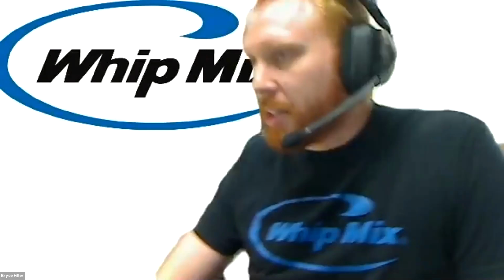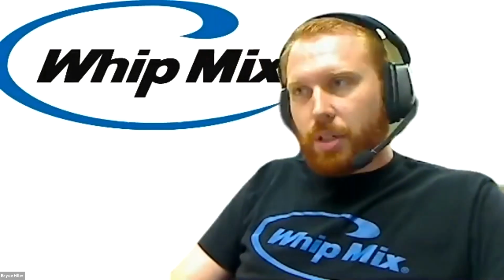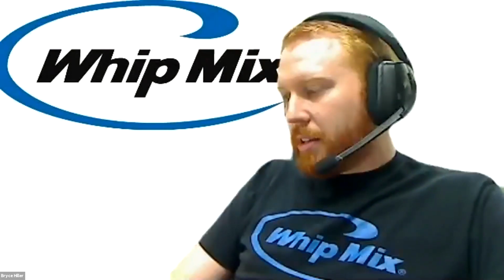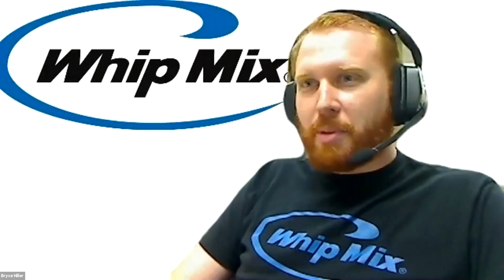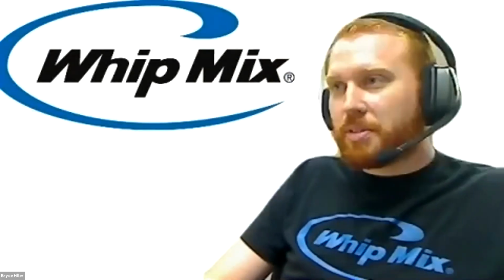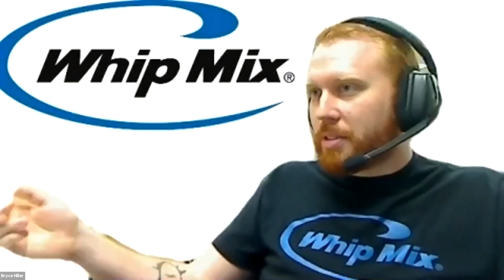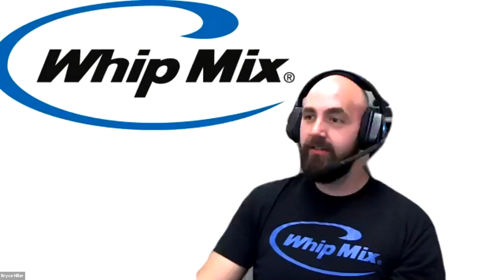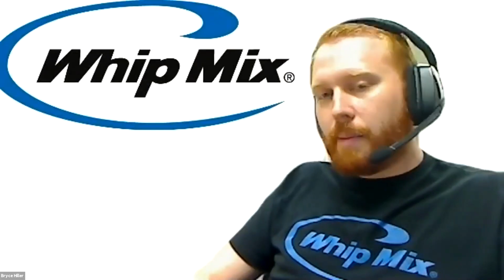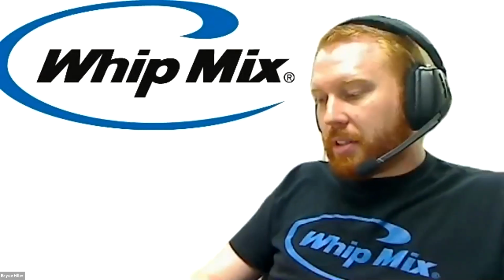Like Cory said, this week we're going to be going over the partials module in 3Shape. I actually really like this module. I think it's probably the most fun. You get to piece together all your different components for your partials, and it's a really fluid piece of software. So we're going to be designing basically a cast partial.